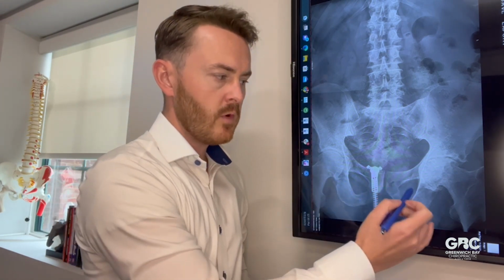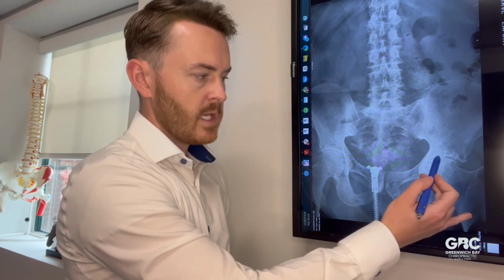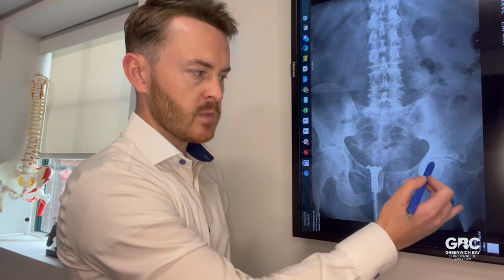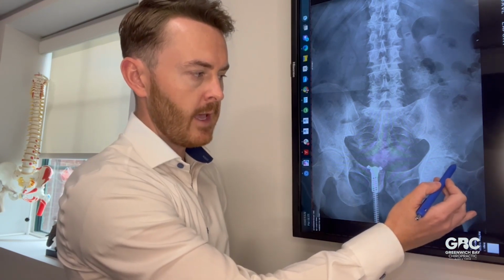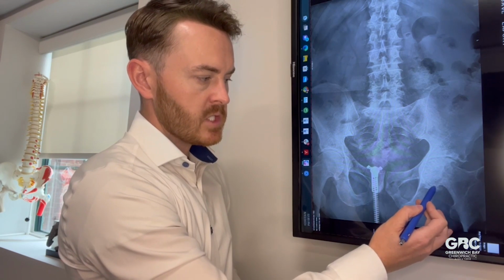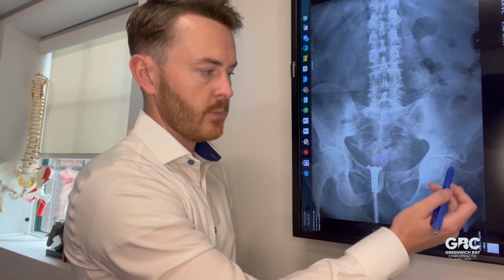Now, as we move over, what we can see is that there's a bunch of things happening here, right? So this hip joint space is a lot more narrow. The bone is chunkier, it's remodeled, and if you look at the femur head and the ball of the femur, you can see that it's starting to deform or change shape. What we know is that happens over a period of years, but because that hip joint starts to degenerate, the way that it moves in the cup itself, it's an inflammatory process.